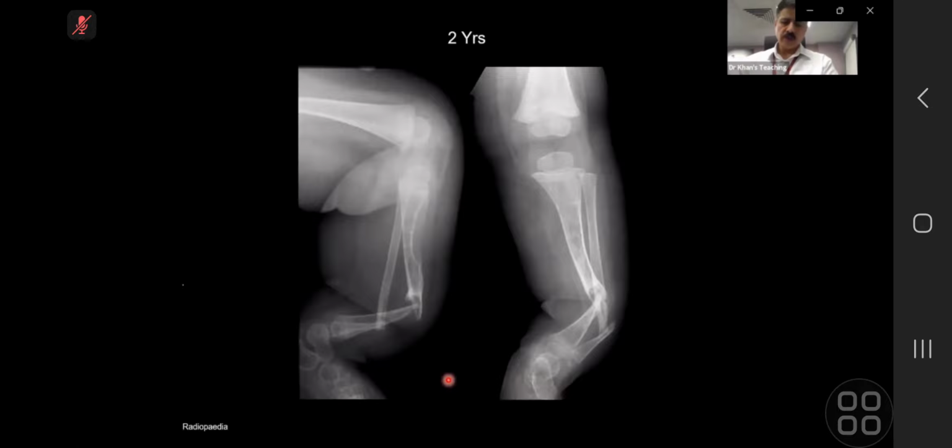Right. So first of all, let's go to your description, and you asked for other films, which is fine, but there was nothing on other films. This is not osteogenesis imperfecta, right? Second thing in your differential diagnosis was neurofibromatosis, and that is the correct diagnosis. You tell me why.